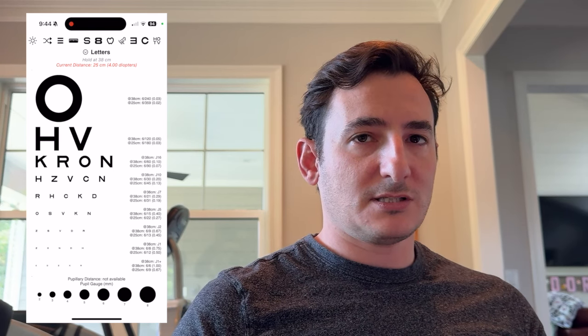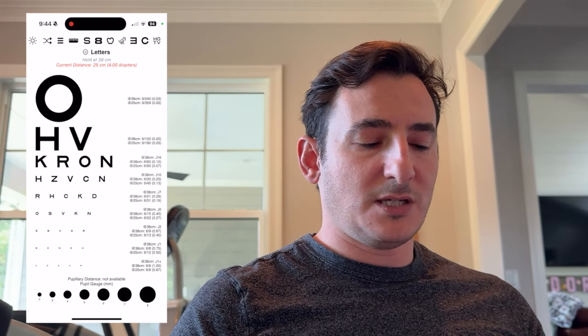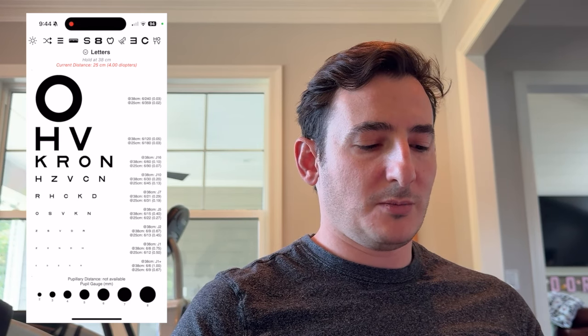Adjacent to this button, you'll see a ruler. Now if you tap this, you'll switch from the imperial system to the metric system and vice versa. And we'll go over the labels in more detail, but this basically just switches between imperial and metric mode system.